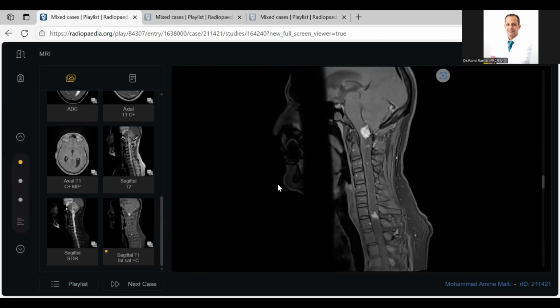These are suggestive of spinal hemangioblastomas and cerebellar hemangioblastoma in a patient with von Hippel-Lindau syndrome. I would convey my findings to the referring physician for genetic and family screening, as well as MDT referral for this patient. But the first and foremost step would be the urgent management of the obstructive hydrocephalus in this patient. Doctor, thank you so much.